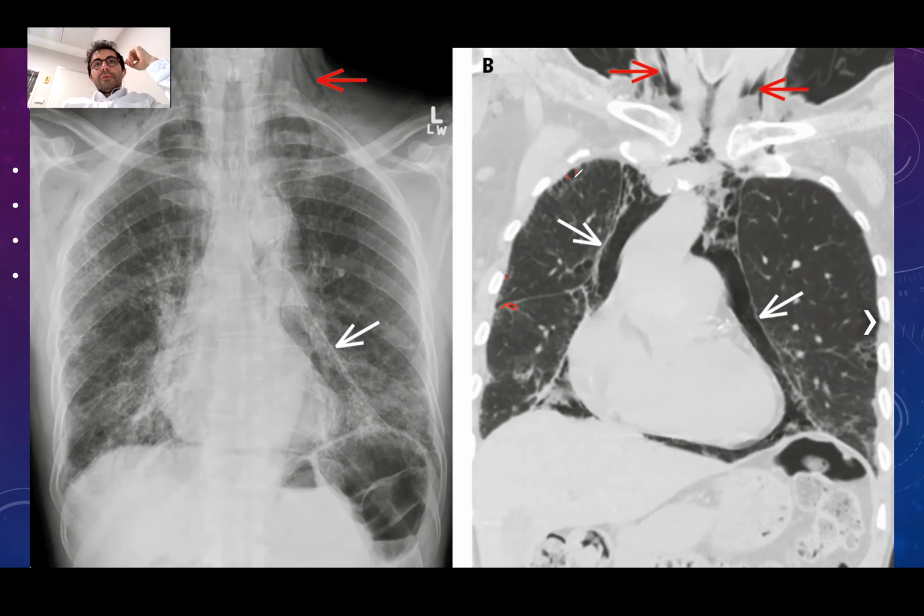These are cases of emphysema with thick walls, for example. But defining the interstitial opacities and maybe some areas of consolidation on the left side is enough for us from the radiological perspective. Then when it comes to making the differential diagnosis, it can sometimes be hard, even for radiologists like us.